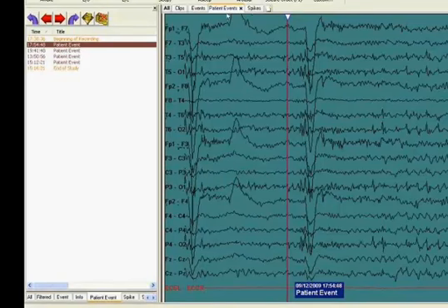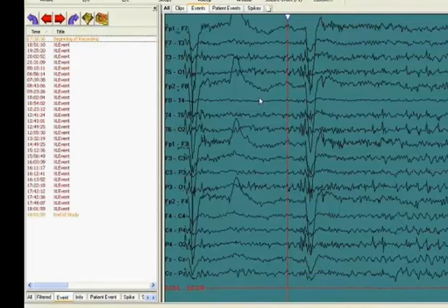Alright, so the same goes for your events. If you are only interested in looking at XL events, and let's say you've got a total of 10 events, each lasting approximately 10 minutes, we're looking at 100 minutes of our study versus looking at 72 hours, for example.